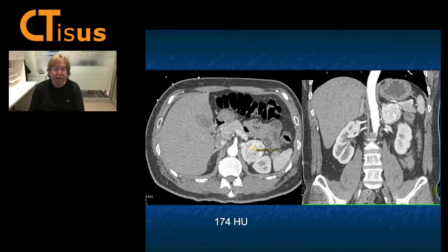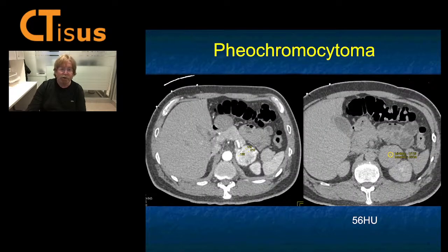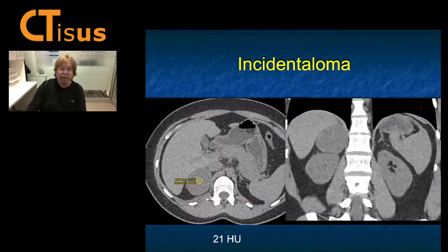You could think about a hemangioma. That's an unusual lesion. I saw one in conference a couple weeks ago, but those are peripheral puddling. They often look, the few I've seen, like hemangiomas of the liver. That's not the case here. If this was in the liver, this would be a metastatic neuroendocrine tumor or a hepatoma. So just a really, really nice case, which was a pheochromocytoma. Okay, let's go to the next case.